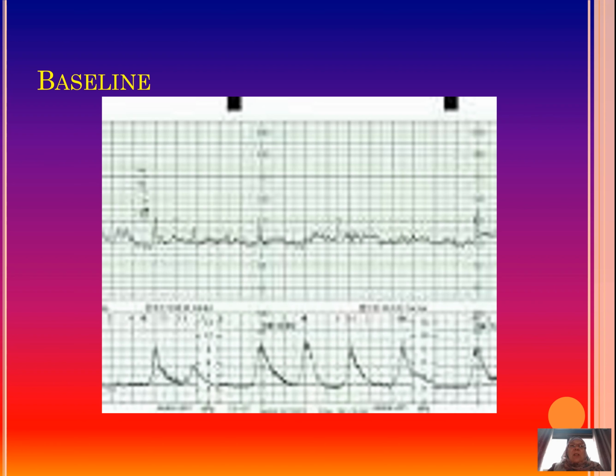But here, if we just look at the CTG, you can see first the contractions. You see this patient has contractions, and here you can see within 10 minutes, from one row of numbers on the contraction monitoring to the next, there are 10 minutes, and you see 4 contractions in 10 minutes. They are sort of regular, although before then she seems to have a phase of irregular contractions. So we might need to have a look at a longer CTG monitoring for this patient.